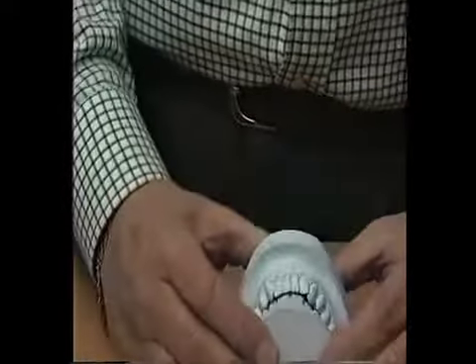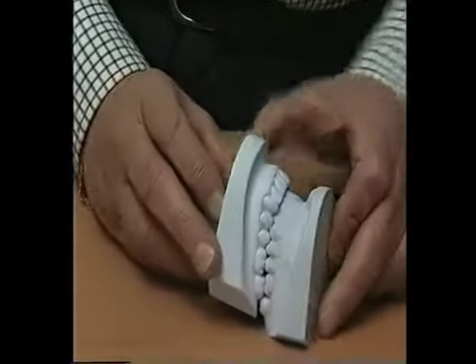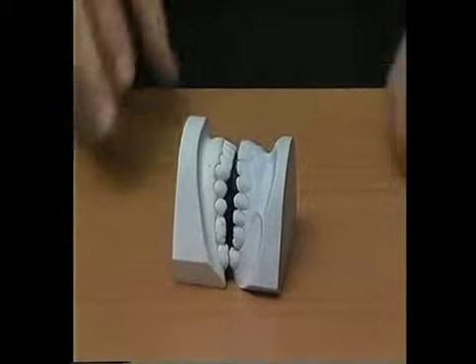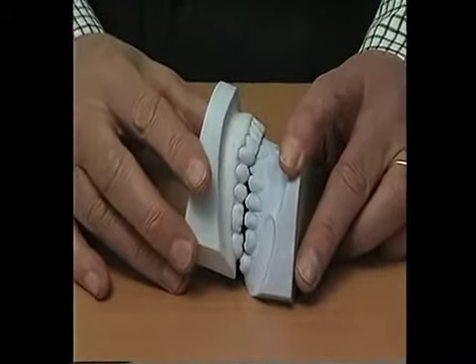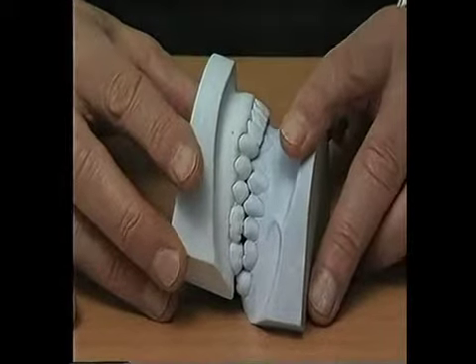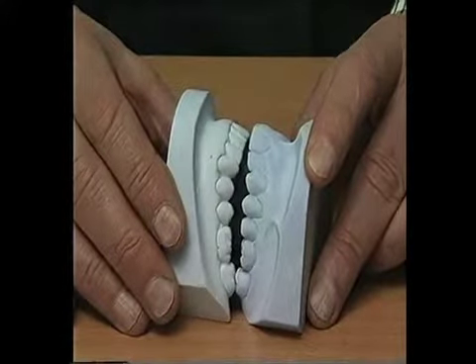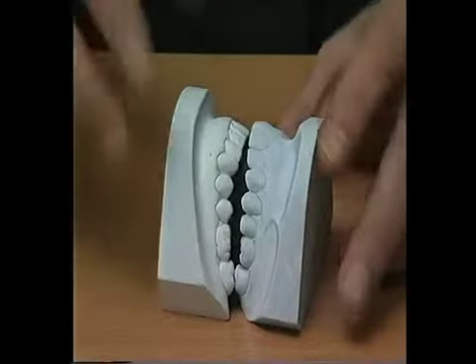The first impulse you have is to position the models in an habitual occlusion and to lean them on the posterior base in order to see what is the movement of those models. This is the reality that indicates a very important issue. As we will see later on the evaluation of the data chart, this is not a real third-class case, but functionally can be defined as a second class. That means a third class with the function of a second class.